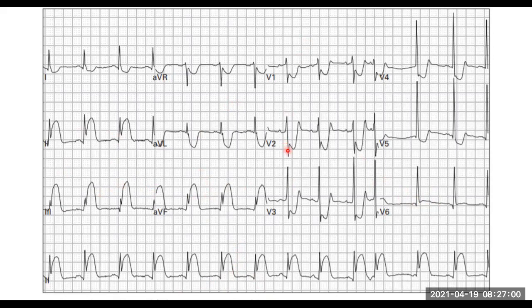If we look at the heart, V1 and V2 are sitting in the anterior part of the heart. Agreed. And they are mainly looking at which part, the right ventricle and the septum. All right. And then what's right at the back? The posterior part of the heart. Agreed. So how do we check the posterior part of the heart? On a normal ECG, we actually look at V1 and V2, because they are looking at that, all right?